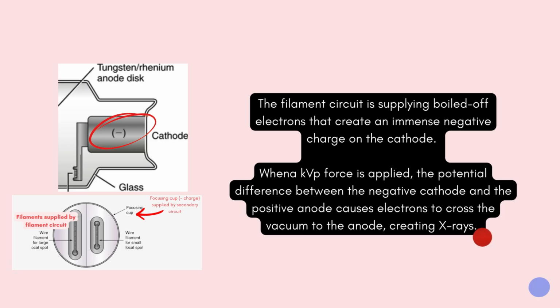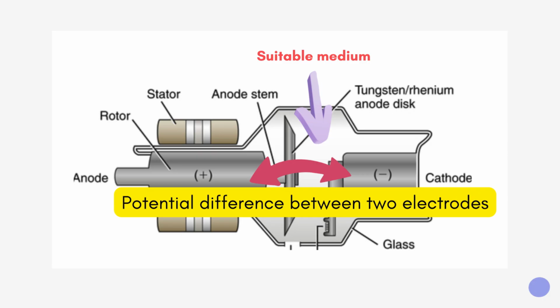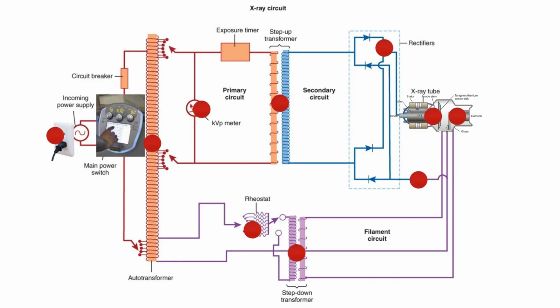If on this screen, if you get there, you press this dot, it'll just take you to this screen here. So I hope that helps with the X-ray system and try and explore this for yourself as well.